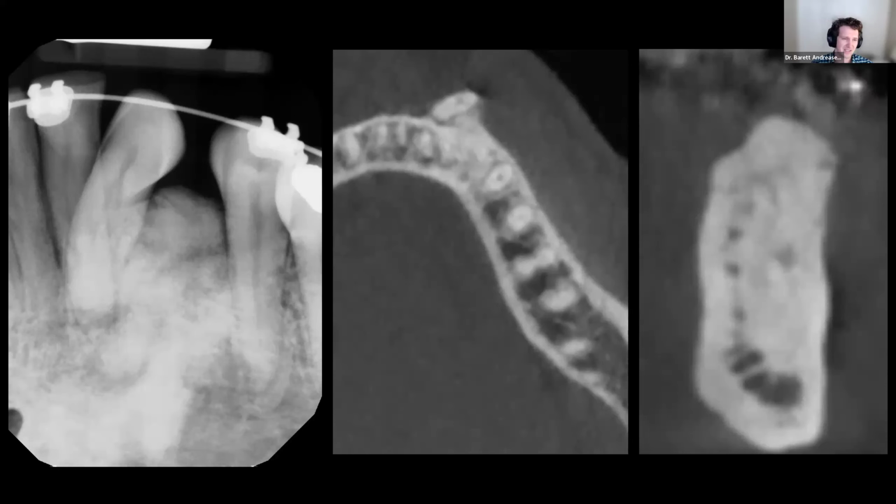And as we said, that tooth number 22 is not positioned entirely correctly. What was happening in this case was that the orthodontist was trying to move this 22 into its proper position. That number 22 got a little bit pushed outside of the mandibular arch. And the question is, what is this radiopacity here that had caused that? So this radiopacity, we'll talk a little bit more about this later, but this is what we call a dense bone island or idiopathic osteosclerosis. It's essentially an area of dense cortical bone where trabecular bone should be.